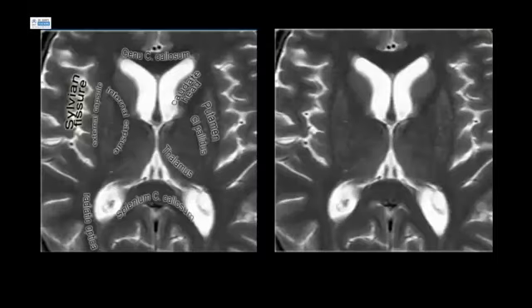We're now just going to look again at the basal ganglia structures, and these slides are more for revision purposes. So we have the head of the caudate nucleus, the lentiform nucleus, so the putamen and the globus pallidus. The thalami lie in here. So internal capsule, external capsule, insular strip, and Sylvian fissure.